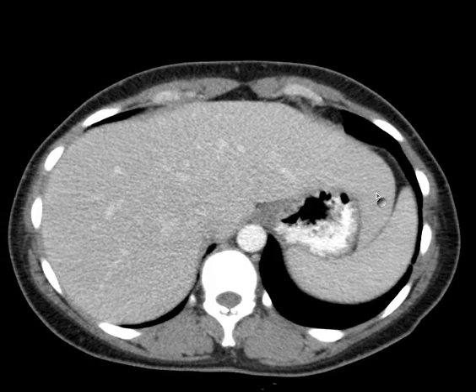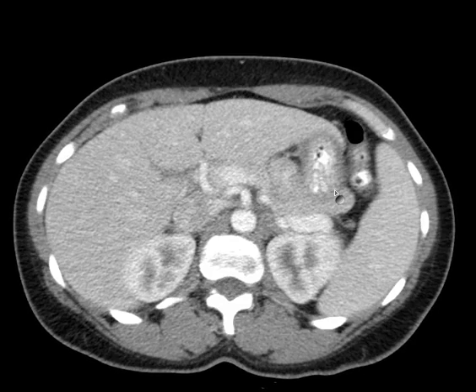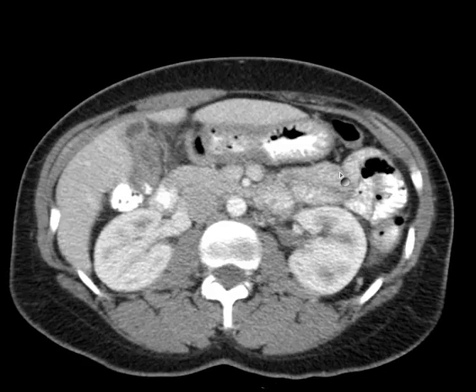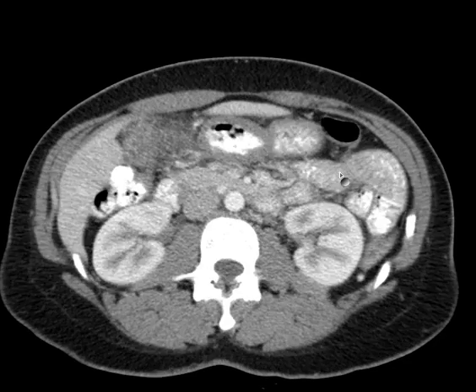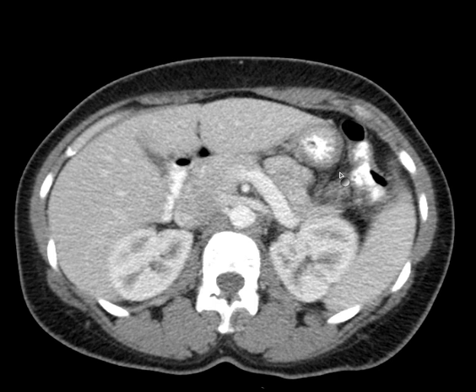And I think it's important for credibility with radiologists and other medical professionals that you are conversant at least with the basic anatomy on cross-sectional images, and that you're able to recognize abnormalities.